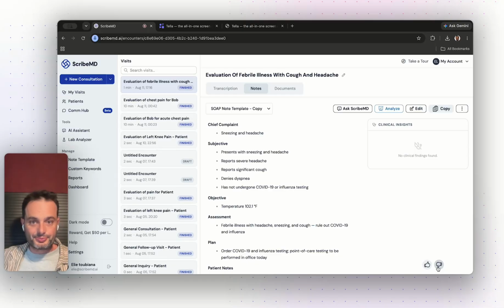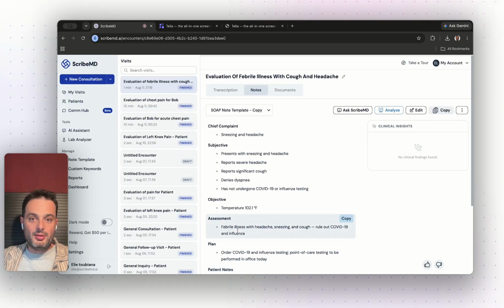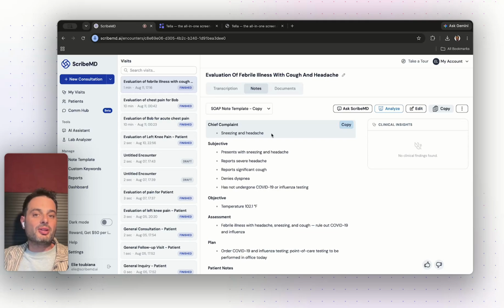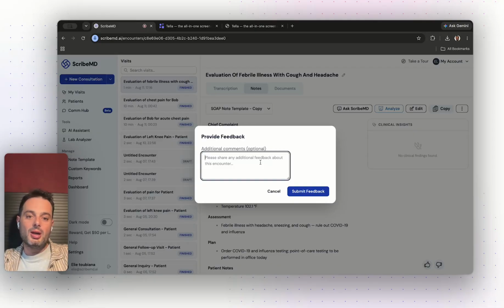I'll give you an example. Let's say here you really don't like that, maybe those are not full sentences, right? So you can give feedback and say, actually I would rather have full sentences.